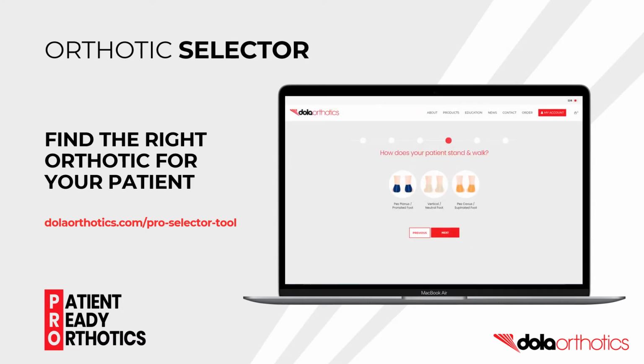How does the patient stand and walk? This allows you to select from 3 options: pes planus or flat foot in the pronated foot, a neutral or vertical foot, or a pes cavus high arch supinated foot. In this example, they selected pronated foot.